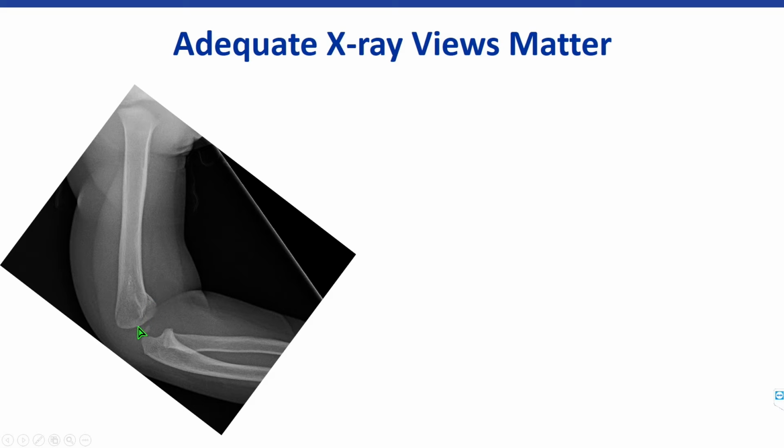So if we're looking at this, I would first and foremost tell you I'm concerned about the image itself because we don't see that hourglass sign. Is there an effusion or not? It does not appear to be, but again, a lot of concern about the x-ray itself. So question mark on the effusion.